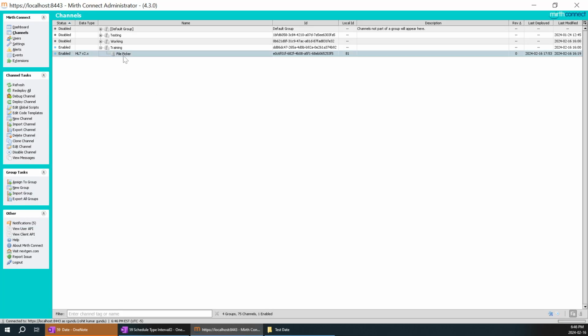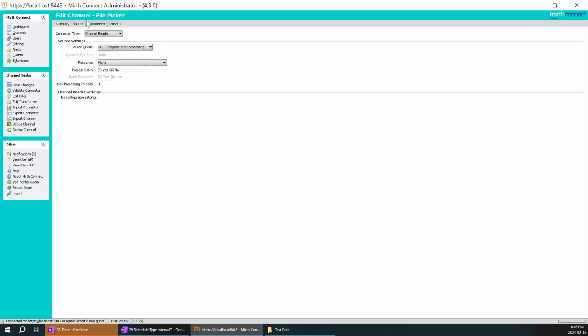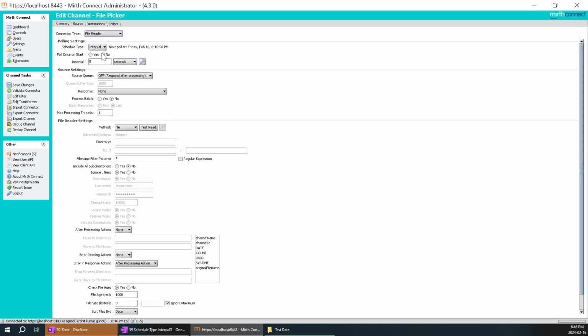I already created a channel known as file picker. I'll double click on it. In the source, I can do one thing. I'll just go to channel reader and save, yes. Yeah, I'll start from scratch, because when we create a channel, it will be like this. I'll go ahead and create a file reader.